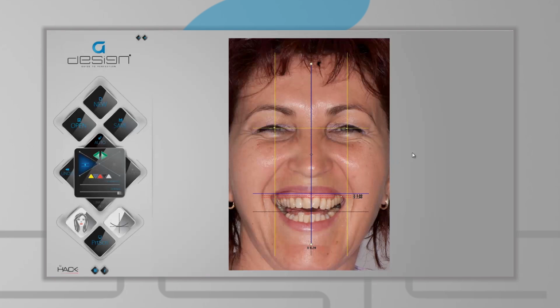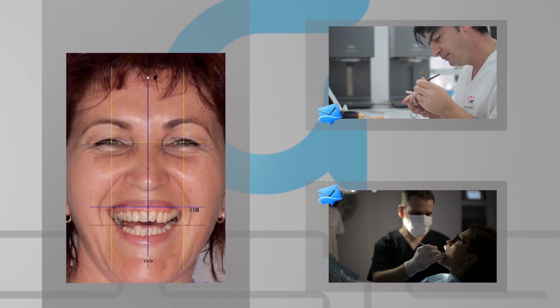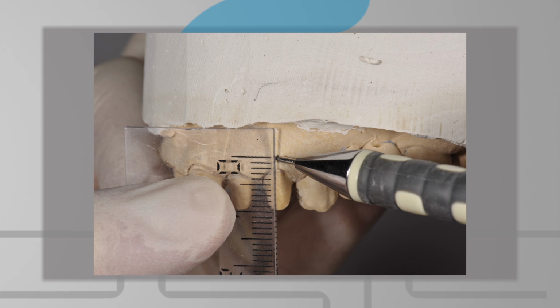You can capture the portrait photo and the existing information by pressing Print Screen. The image can be sent via email or any other method to the laboratory or to fellow dentists. The transfer of the axes onto the plaster cast following the information offered by the transfer lines.